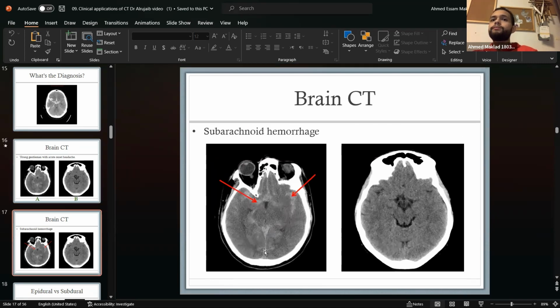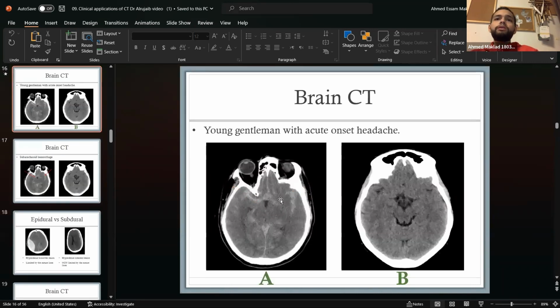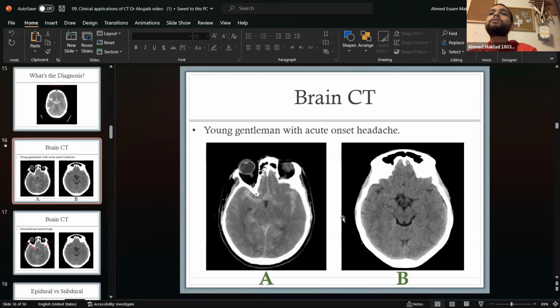As I said, B is not subarachnoid hemorrhage. B? What's B? Where's B? Oh, no, B is not subarachnoid. B is the norm, so this is just a comparison. In CT, if we can tell between white and gray matter, we assume normal. This is an edema test. If you can't differentiate between the gray and white matter, you assume that there's edema, but not bleeding.